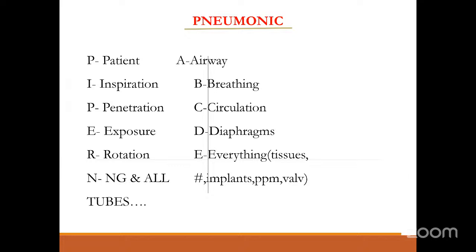There are many mnemonics for how to interpret an X-ray. The first would be P for patient, to identify that you are seeing the image of the particular patient you are concerned with. Next, you see whether we are seeing an optimal film. Optimal film in the sense, for a chest X-ray, have we taken an image in a proper inspiratory phase?